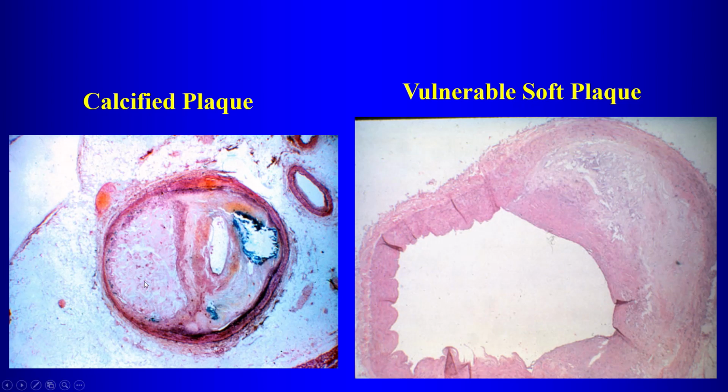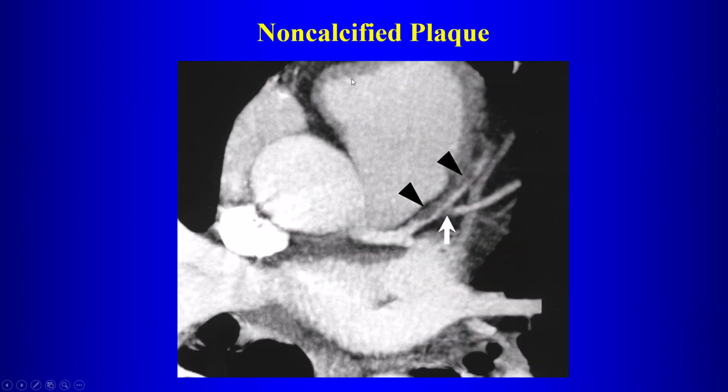These patients might have severe stenosis with calcified plaque, as demonstrated here. The problem is, early in the natural history of coronary artery disease, patients can have lipid-filled plaque within the wall of the vessel without causing much stenosis. So these patients can be asymptomatic, and so it is rupture. This plaque is also vulnerable to rupture because of the high lipid content. So this is where a patient can present with myocardial infarction as their first sign of coronary artery disease.